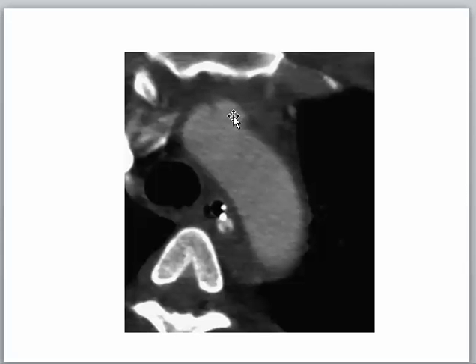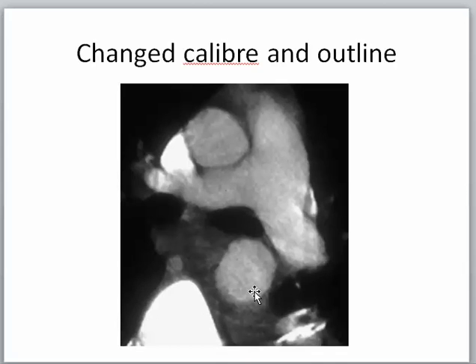Nobody will notice that there is some small bulge there, except if you put in mind that in trauma the sternum is compressing, and compression will cause subintimal and intimal tear, which results in such an appearance. This is pseudoaneurysm of trauma, post-traumatic pseudoaneurysm. If extending, it will result in such appearance if extending posterior.